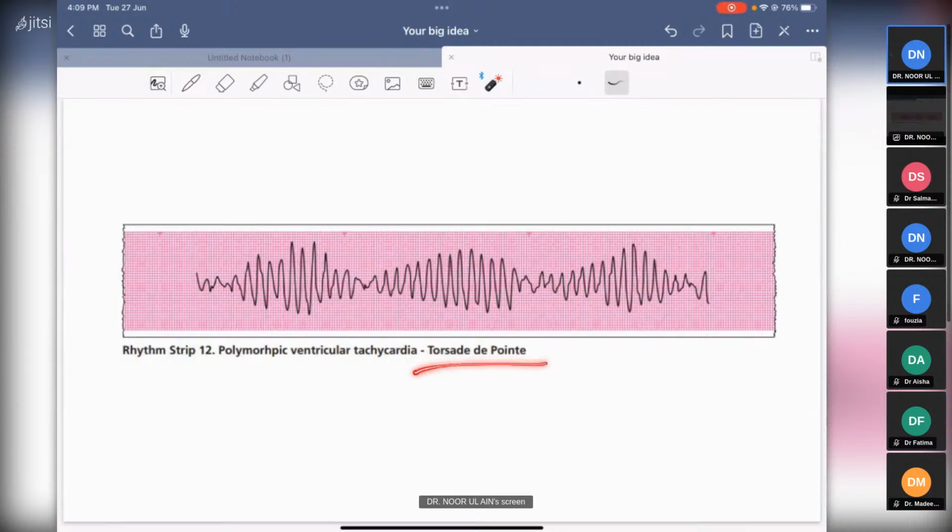And this is a French word, torsades de pointes. I'm not even going to pronounce it. And you guys know what this is because of? There is a problem with something that is decreased, which is your magnesium, and that is what causes a polymorphic ventricular tachycardia. Right? Good? Easy? Now if they ask you, how to differentiate between VT and VF?